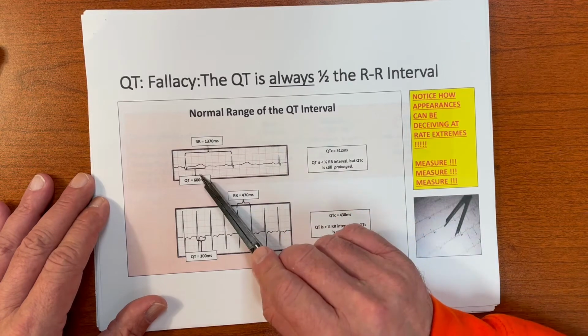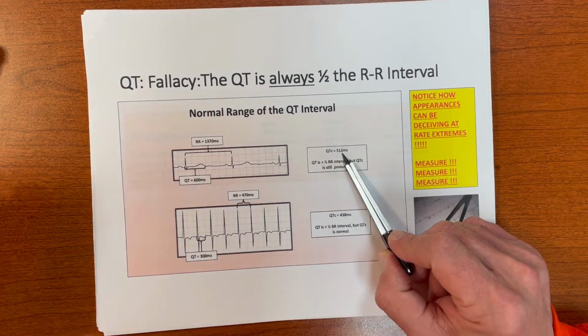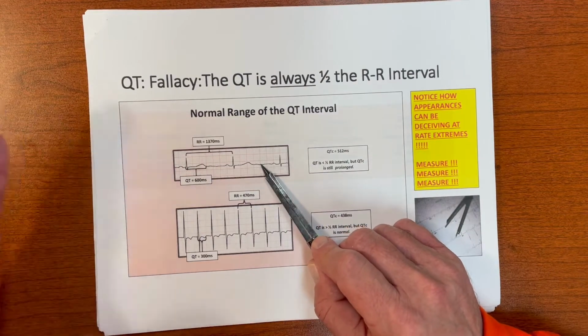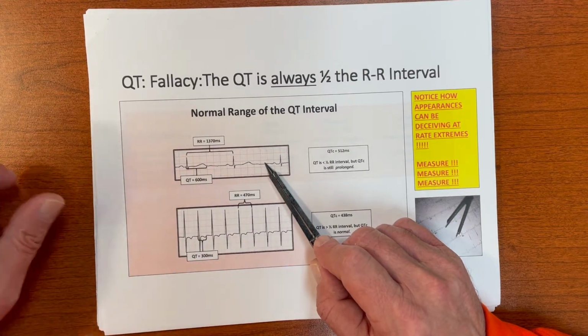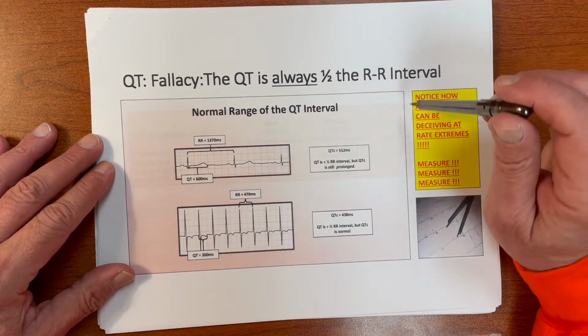However, when you calculate this, the QTC is 512 milliseconds, which is high risk, as we'll see, for VTAC and sudden cardiac death, and this apparently eyeballed to be normal. Don't ever fall for that. Don't ever believe it. Use your calipers, folks.